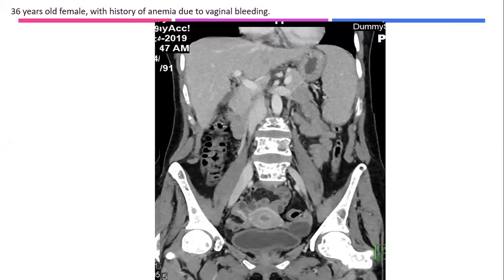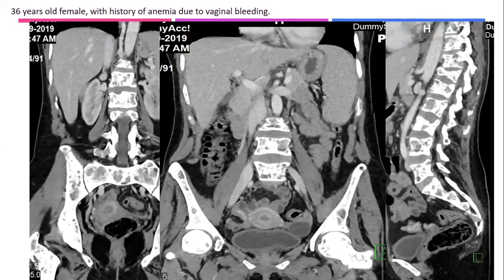Multiple bony lesions, multiple lytic bony lesions. Excellent, well done. Yes, her problem is bones, and this is BI-RADS 1. You see, BI-RADS 1. But this image demonstrates, look, even she has a collapsed vertebra, and the bony lesion is well appreciable. She has extensive metastatic disease.